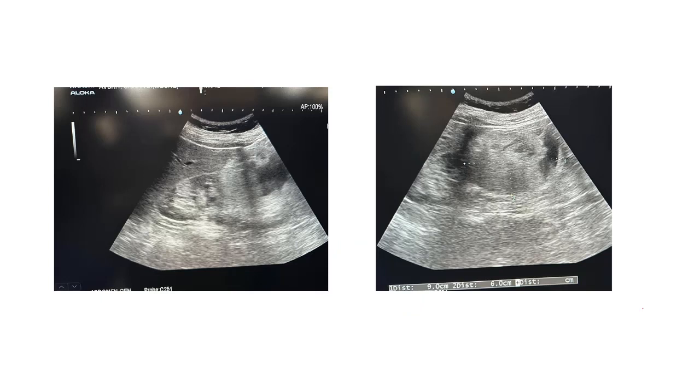So when she came for sonography, these pictures were found. This is the liver, and this is the kidney. On the kidney, this structure was found. This is slightly hyperechoic with some hypoechoic components within. In the next picture, we are able to see this lesion with hypoechoic areas. Measurement was taken like this, and the size came to 9 by 6 centimeters.